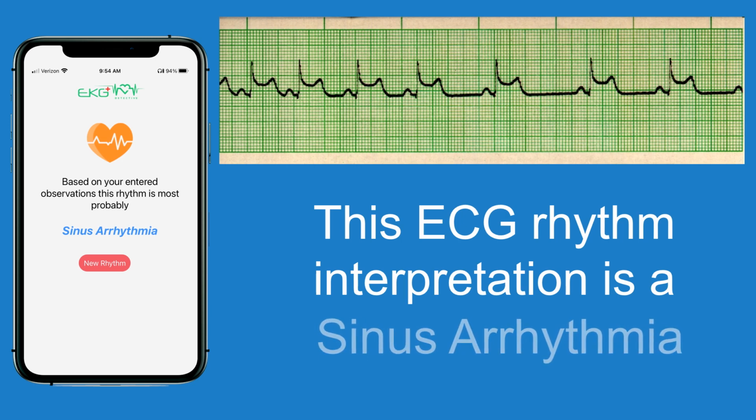And for those who are using the EKG Detective app, it would obviously lead us to a sinus arrhythmia because that's the dysrhythmia and the topic of discussion for this video today.